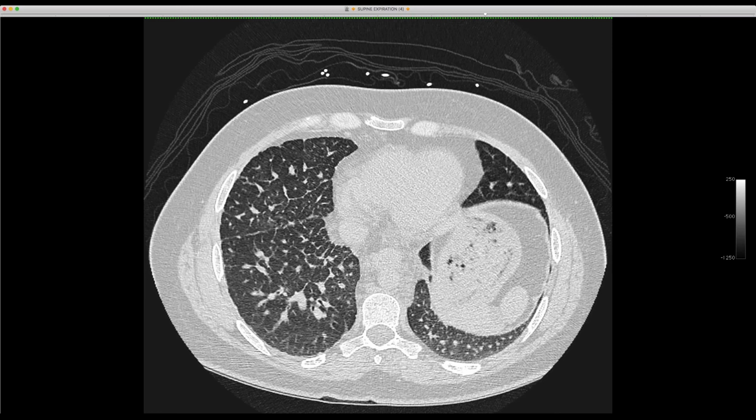But very fascinating case. So this is different than congenital lymphangiomatosis? Correct. Which is interesting. My understanding of it is that lymphangiomatosis is proliferation of lymphatic channels. Sort of you get multiple lymphatic malformations all throughout, whereas this is just sort of dilation of the pre-existing lymphatics. I have a case I can show next week, a second case of lymphangiomatosis that I dredged up from, had scanned from the film days. It looks a lot like the case that I've shown before that you have in your teaching file now.